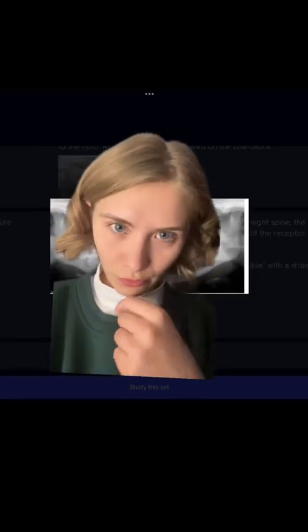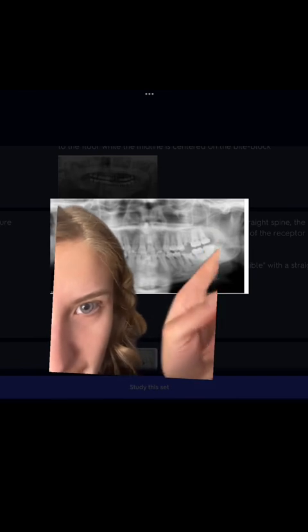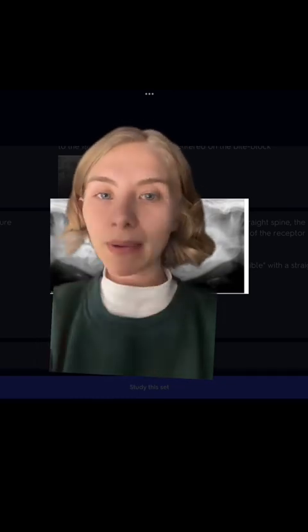They're too bent, like their neck is not in a good place. That's why you can see their spine too much. Their spine actually should be on the sides, right here. So when you have a patient that's not standing up all the way, make sure their head is up and biting on it.